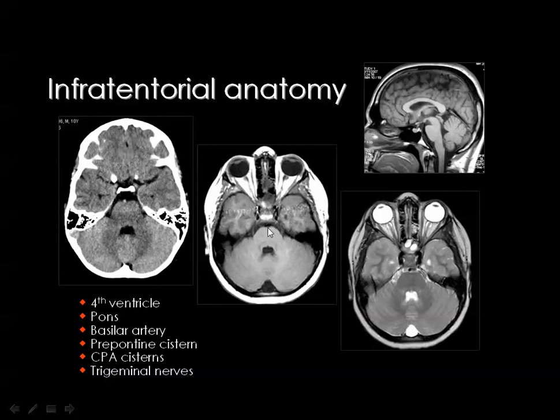Then the basilar artery will appear on MR images as a black dot in both T1 and T2 weighted images because of the well-known signal void phenomenon, as I hope you all know. Then look at the anatomic details I have written here.